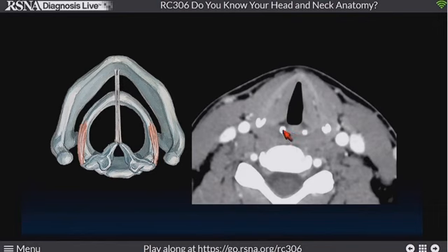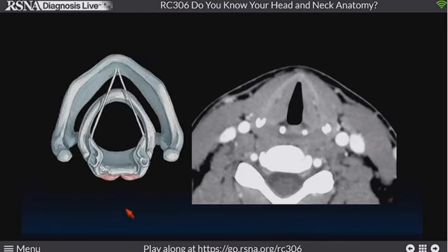Has this got something to do with a dislocated arytenoid? This is a young person, and so the arytenoid is just not that well mineralized, but it's sitting off a little bit on this arytenoid slide, if you will. There's a little bit of a facet on the cricoid that the arytenoid will slide back and forth on, but the back of the arytenoid, really its base, never really reaches midline. It's off to the side.